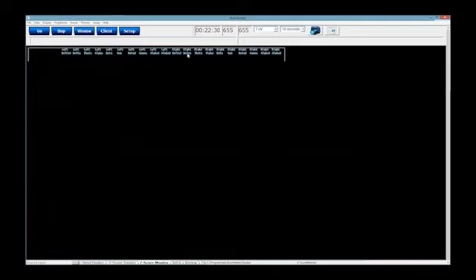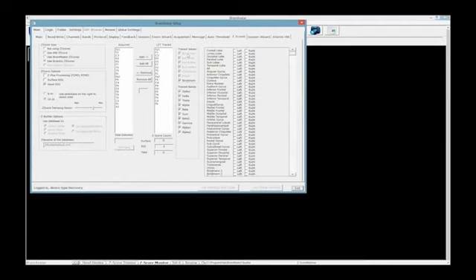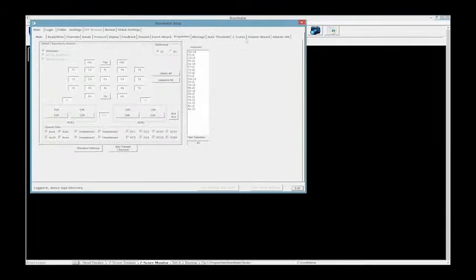So let's start going through things. I'm just going to go to the ZScore page, Control-Z, because there is nothing on the acquisition we need to change. For ZScores, or for sLORETA ZScores, you always need to acquire 19 channels. There's no ifs, ands, or buts about it. If you do not acquire 19 channels, you are doing it wrong and you're getting a wrong answer. So you must always, always, always acquire 19 channels. So if you're opening up this protocol, don't even touch this page.